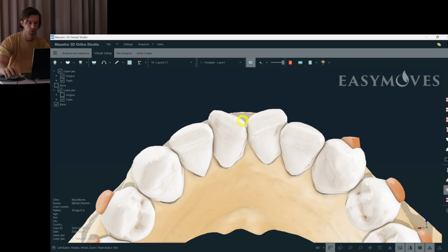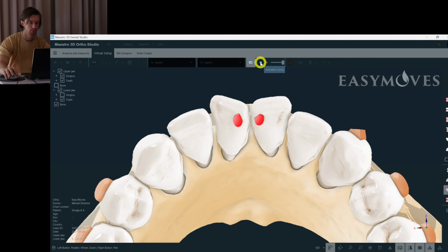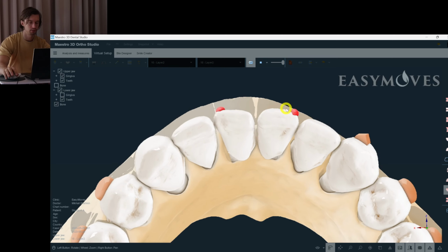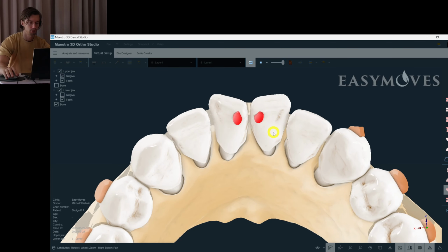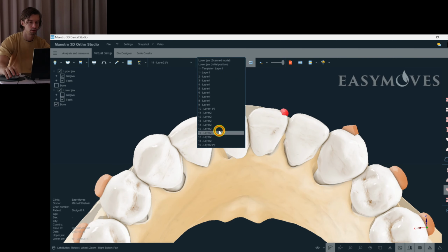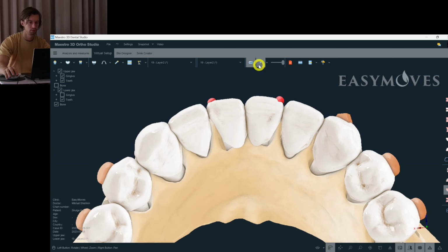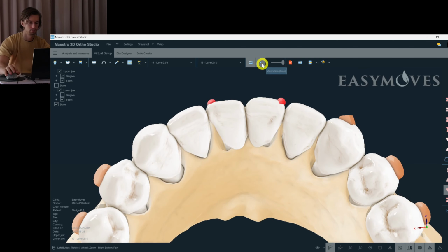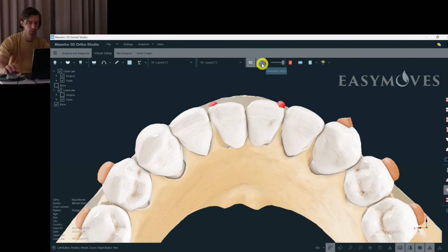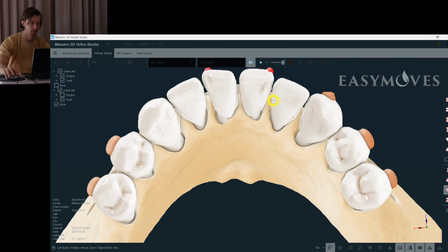We have to strip a lot here between them, but we make a distal tipping, combine it with proclination and rotation, and we don't get any intersections till the very last aligners, where we can easily add some stripping. We can safely, what is more important, add some stripping.